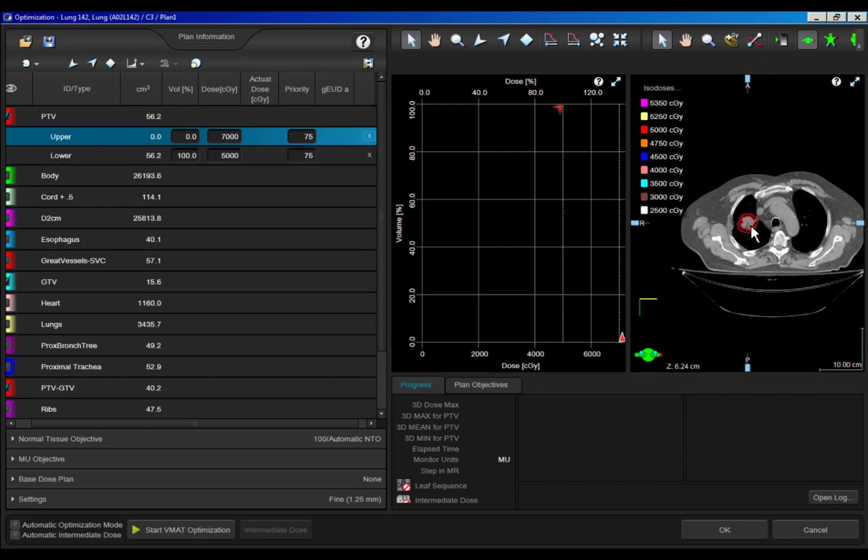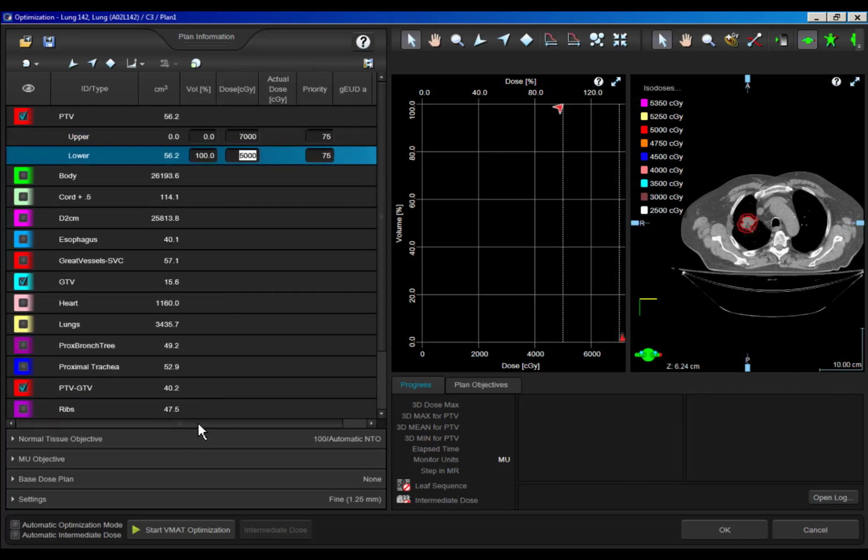So standard lung is 1,000 times 5. I allow those to get up to 7,000. That's just because that's what the SBRT physicians at my clinic like, but some will let that go up to, like I just said, 166%, or most will have their own rules. I suggest for you guys, it's always a good bet to start here, and you can adjust according to how your physicians like to plan these. But for this practice plan, put 7,000 in here.